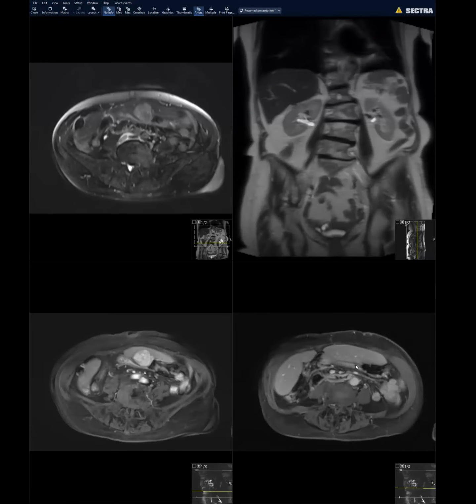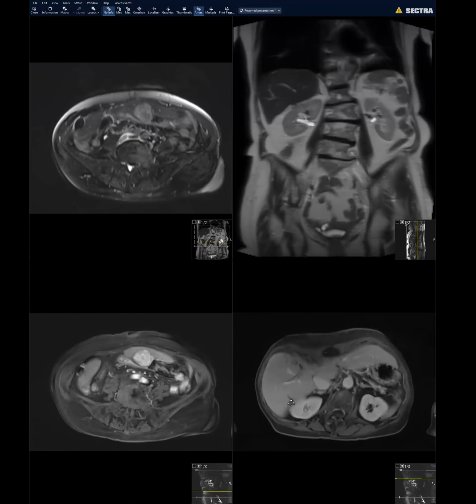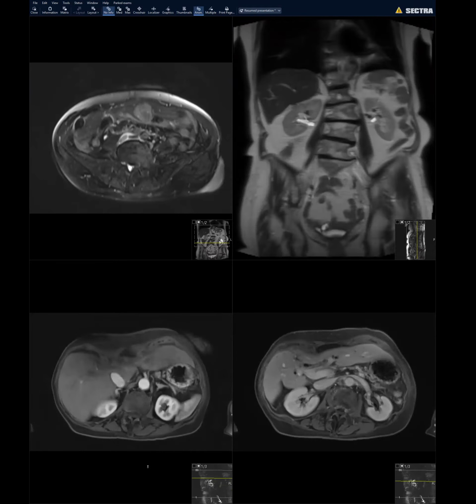But I think the teaching point here was, this is the dictum that I follow. I don't know what Victoria has to say, but anytime I see arterial enhancement, washout, and pseudocapsule, with any presentation, I at least question HCC and recommend tissue sampling, rather than just saying that, given that they have a primary malignancy, this is possibly a met. Right. So unless the patient has parenchymal liver disease, in which case you don't need to do the biopsy. Yeah. Even if there's a primary malignancy somewhere else.